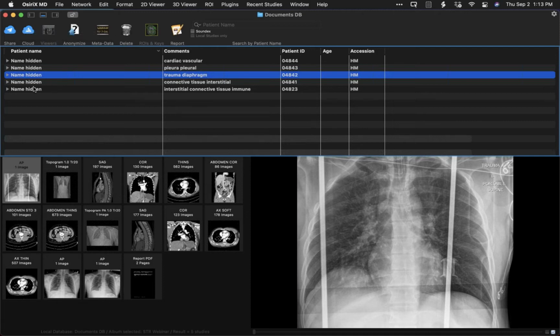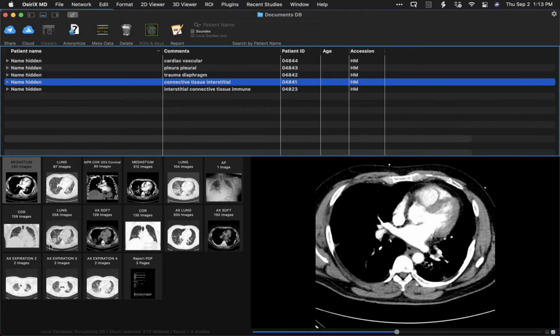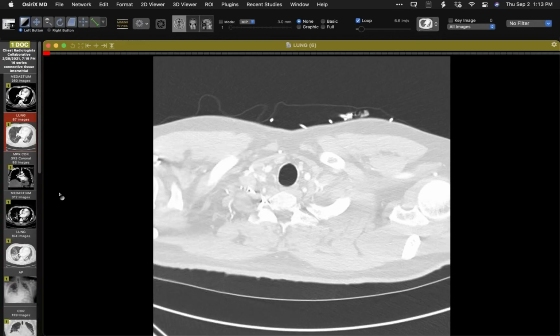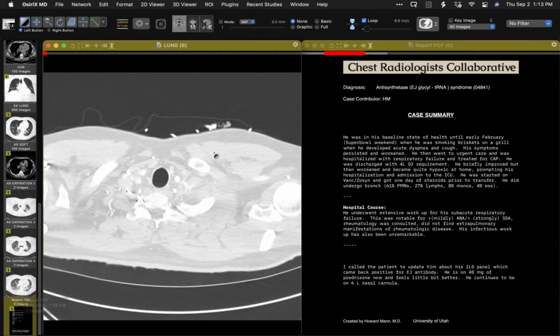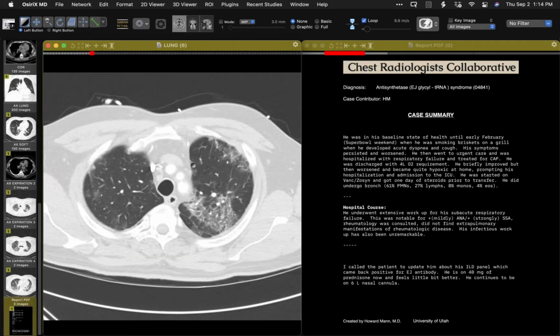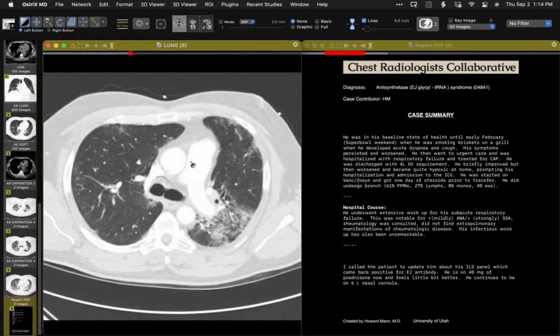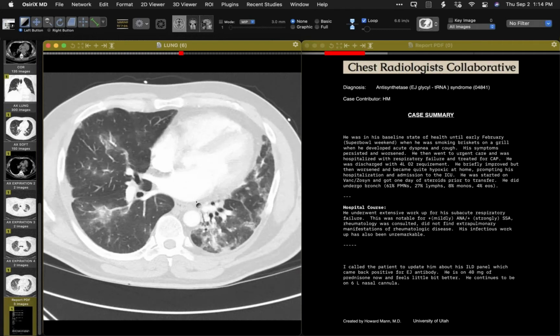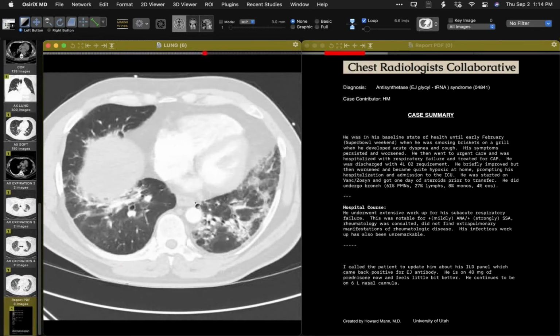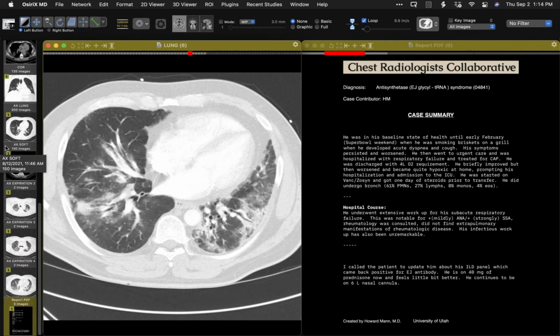Two very fast cases of anti-synthetase syndrome. So I'm going to just display the imaging data directly in the interest of time, with the clinical presentation. So here was a person that was apparently just doing fine. He developed dyspnea and cough, and as is often the case, patients are initially diagnosed with potentially a community-acquired pneumonia and treated for it. They don't necessarily get better, they may get worse. This patient actually became rather sick and ended up in the ICU for a time, and then eventually got some steroids prior to transfer here.